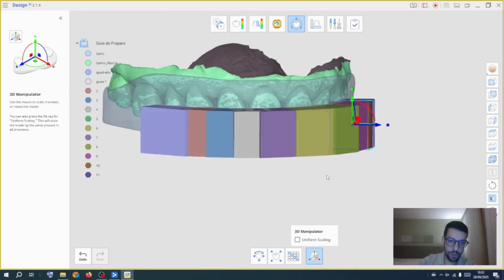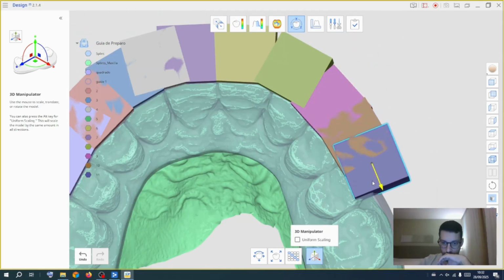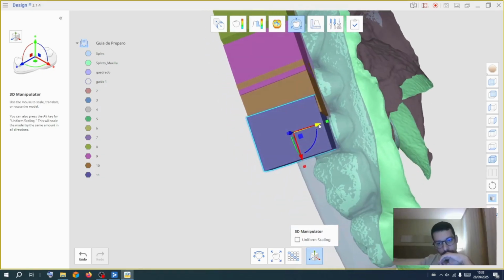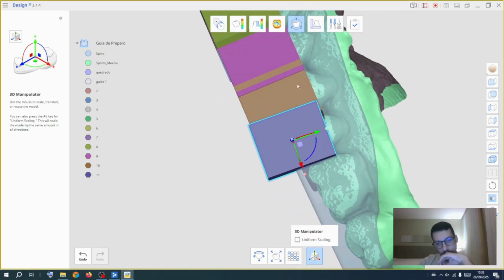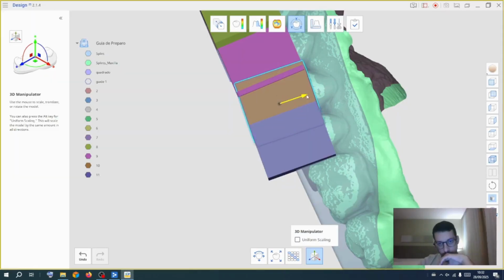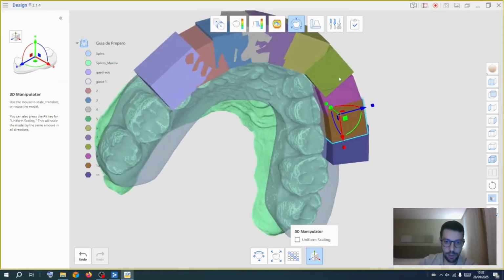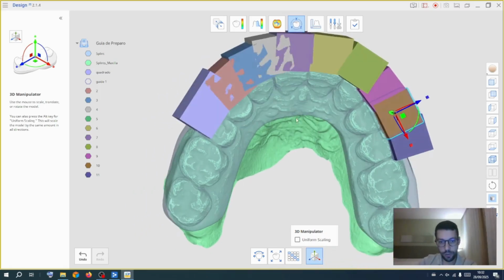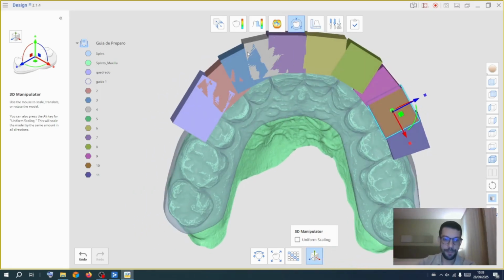So the same thing, I have all these forms. I need to cut from here, so we're going to have this occlusal view from mesial to distal in each element, so we can check if we have the right amount of space, okay?